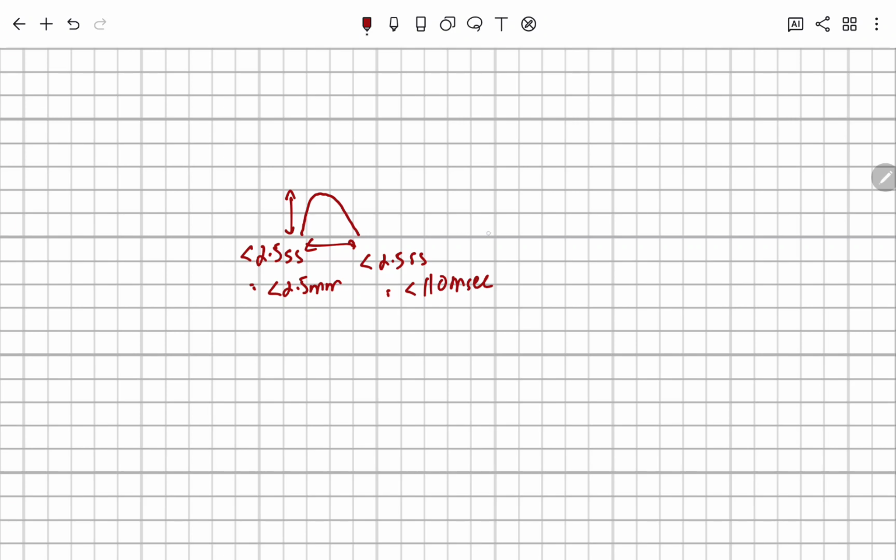If the height is increased, along with that we have the PR segment, then we'll have this QRS complex, right?